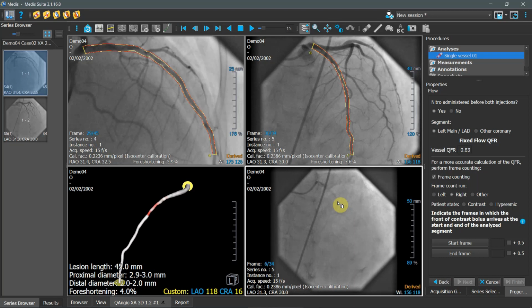And the differences in frames we use to calculate the blood velocity, because we as well quantified the vessel length during the quantification of the 3D model. And as a result, these two concepts we can use to calculate the average blood velocity.